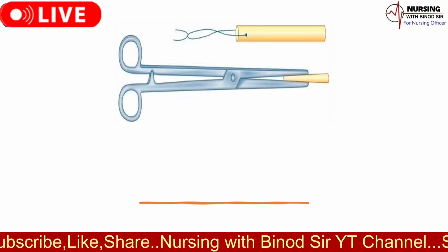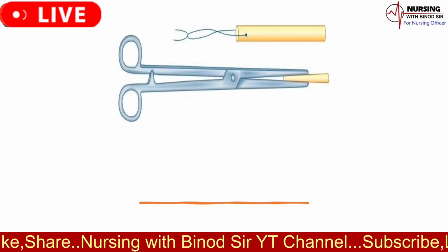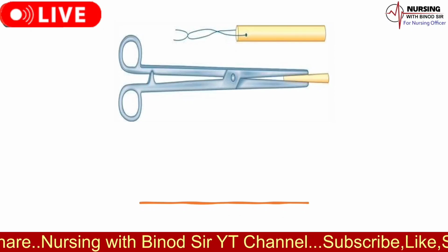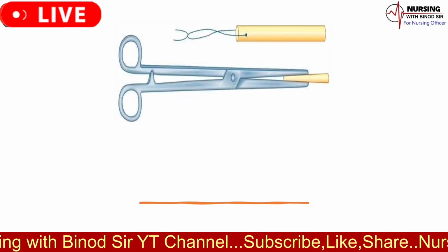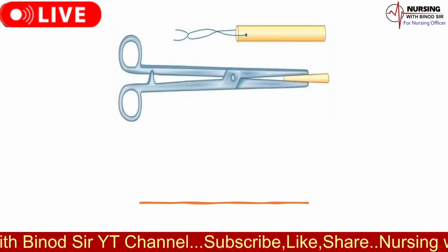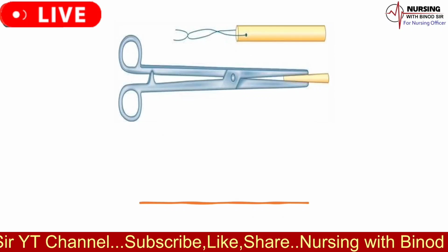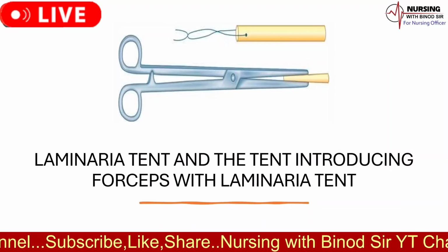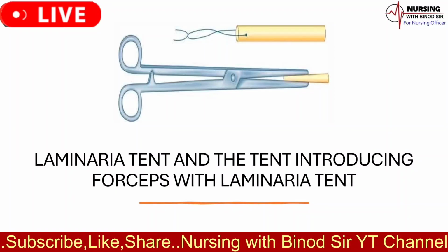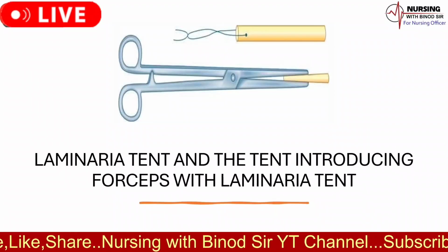3. Induction of labor. Laminaria tents can help induce labor by gently opening the cervix, although they are less commonly used today due to potential infection risks. 4. Endometrial sampling. They aid in dilating the cervix to facilitate procedures like endometrial biopsy. 5. Miscarriage management. Assist in dilation when preparing for procedures following a miscarriage.